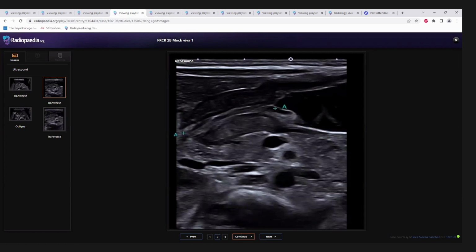Okay, this is, as you said, congenital hypertrophic pyloric stenosis. How do you remember the measurements? They will ask the measurements. You remember it by pi. So one muscle wall should be 3 mm, more than 3 mm.